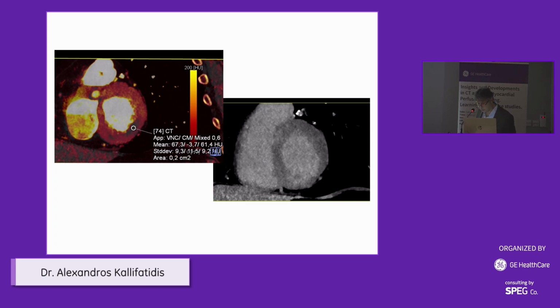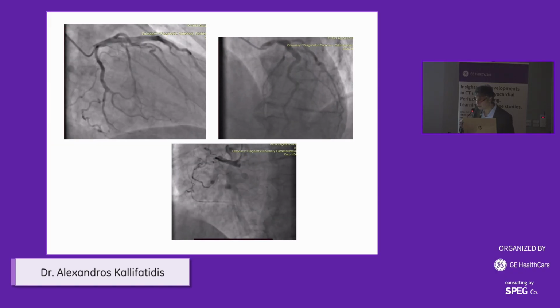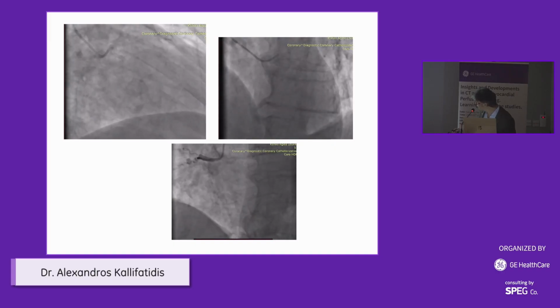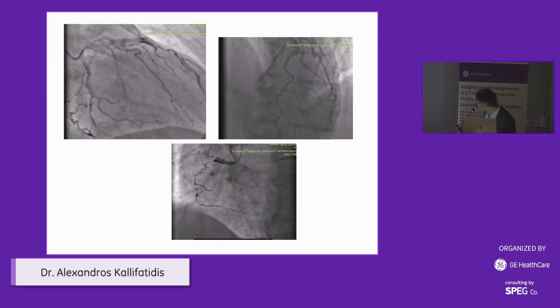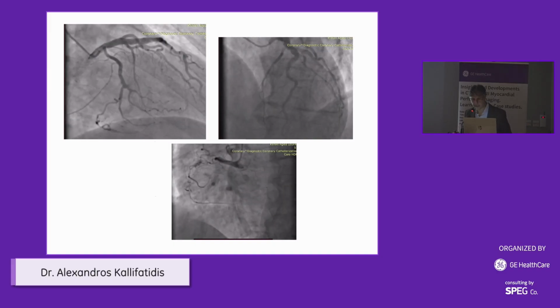Hopefully, with the dual energy, we didn't find any pathologic Hounsfield units in the anterior wall. Also, we saw with the delayed enhancement this old infarction in this territory. This patient, after a couple of months, due to persistence of symptoms, had a coronarography that confirmed the patency of the LAD, circumflex artery, and the obstruction of the right coronary artery.